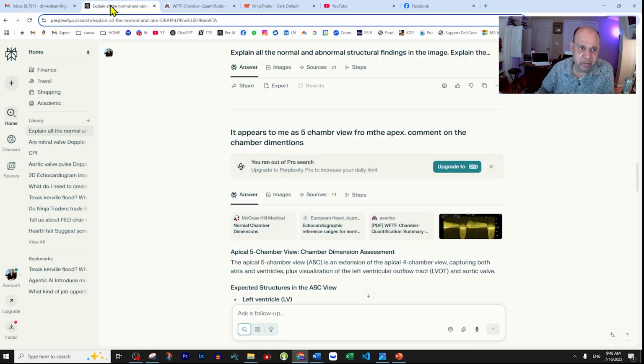So ladies and gentlemen, this is a quick analysis of how AI can help us learn echocardiography in a much more meaningful manner, and also learn all the variations, all the exceptions, and you can go back to the original reference articles to improve your knowledge and wisdom.